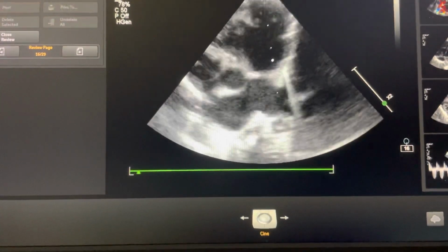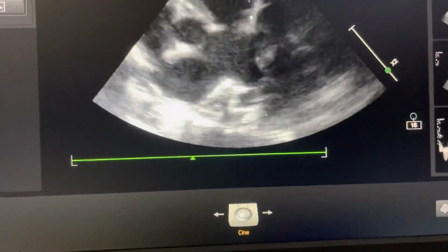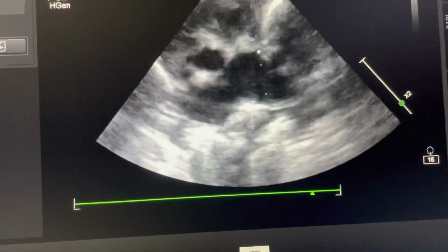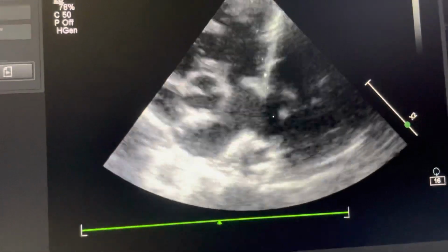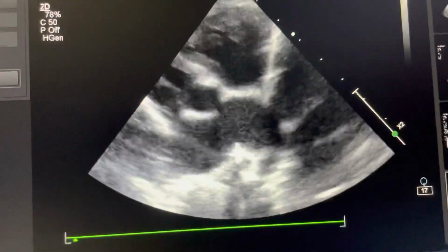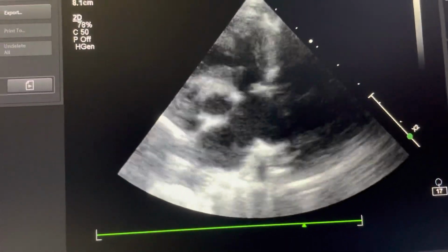What you see in this image, this is the main pulmonary artery, RPA and LPA. So the main pulmonary artery is usually enlarged, RPA and LPA are also enlarged, and the pulmonary valve is quite thickened, more in favor of a dysplastic pulmonary valve. The valve is not well formed, defectively formed. Dysplastic means defectively formed. Next image is the same image. Again you see the pulmonary valve is defective and not opening, so suggestive of significant pulmonary stenosis.